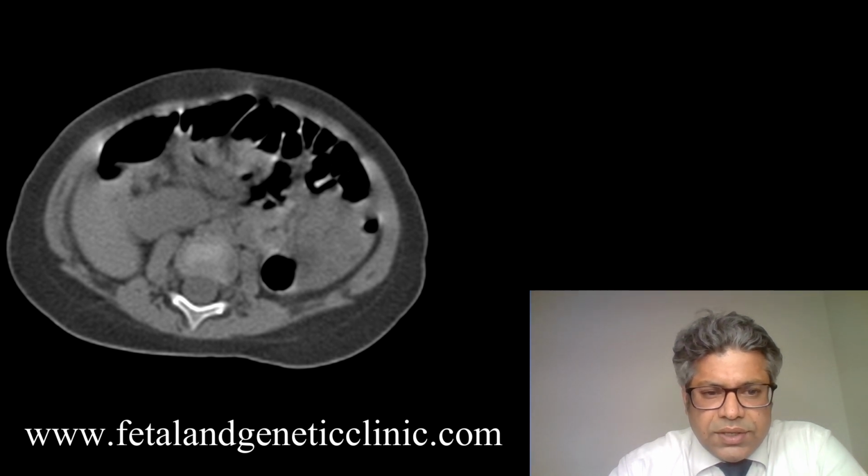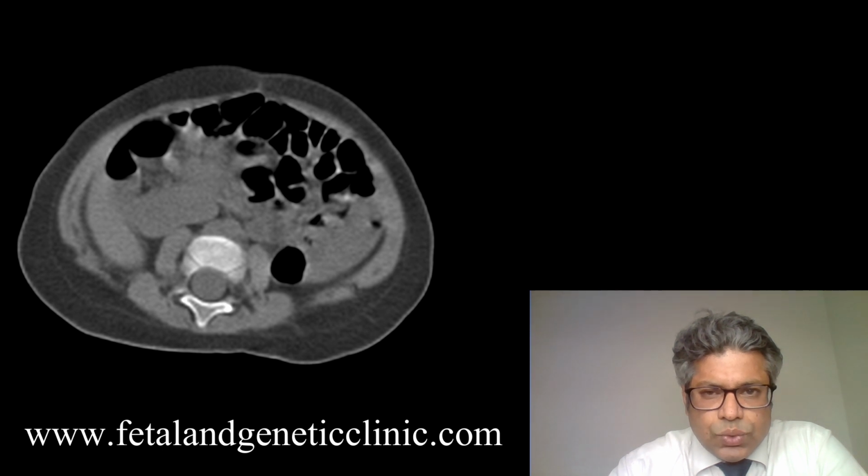So this shows a loss of corticomedullary differentiation. There could be a lot of factors that might affect the functioning of the kidneys in the postnatal period, which we try to identify antenatally. There could be ARPKD, ADPKD, MCKD, and whenever we have a lower urinary tract obstruction, which we call LUTO, because of the back pressure we can have some sort of mesangial sclerosis happening in the kidneys, and therefore that might affect the functioning of the kidneys.